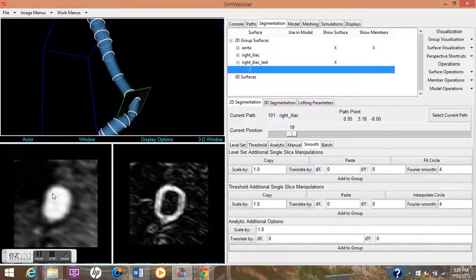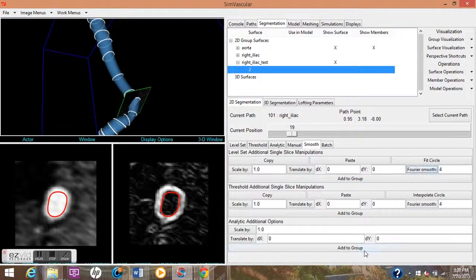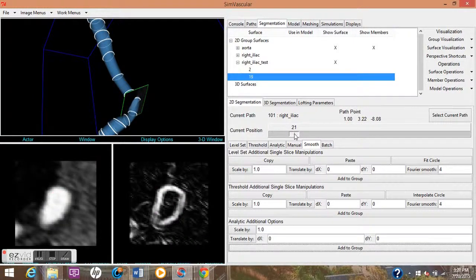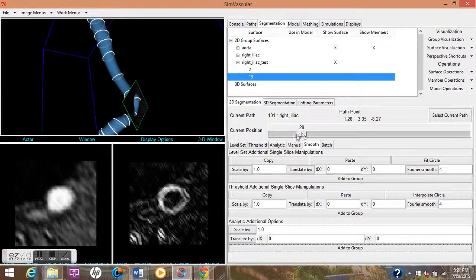And so now I'm just continuing to create my segmentation. This is one of my last ones. It's still inside that aorta segmentation, and as you see, still smaller. And then we're going to just continue to move out until, and see, now we're just getting outside of the split.